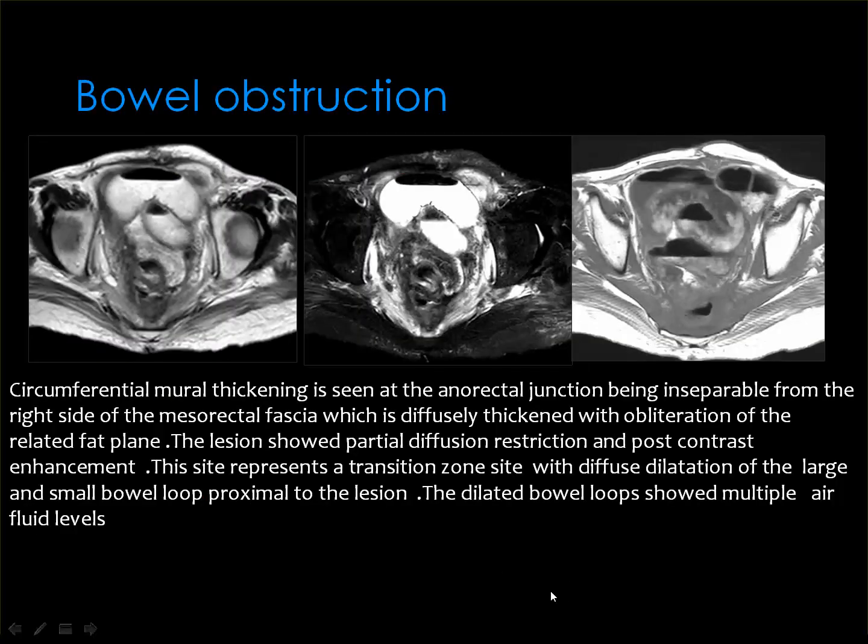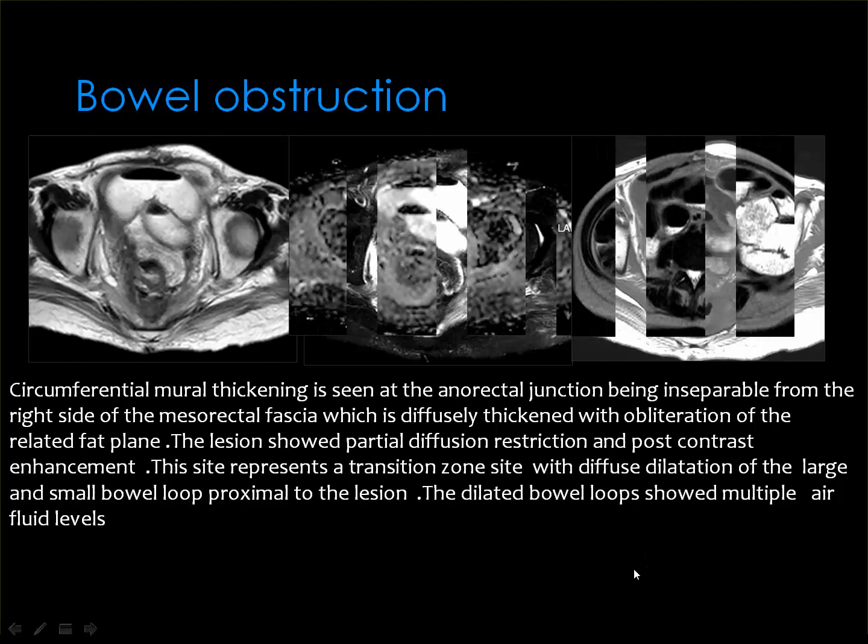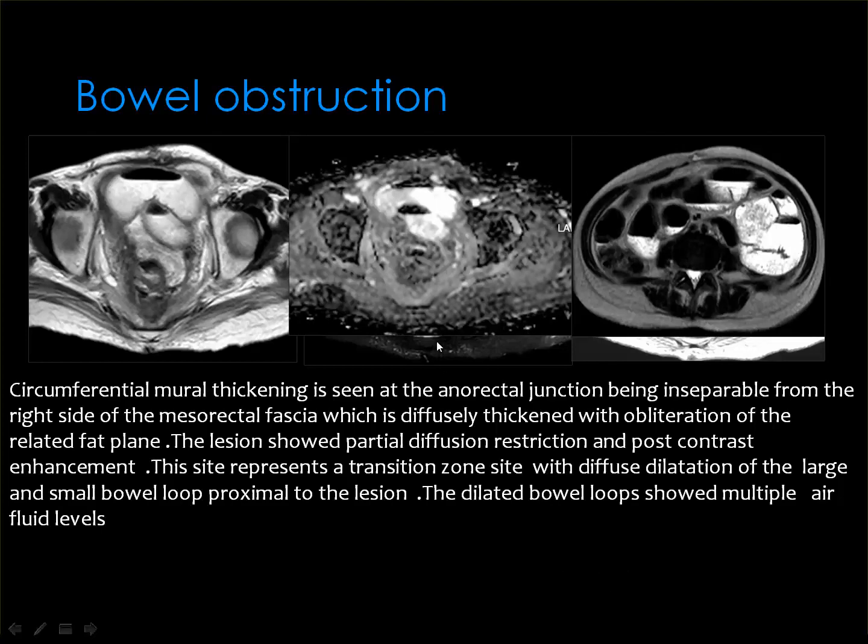And this patient has presented by abdominal pain, distension, and vomiting, all the signs of intestinal obstruction after surgery for rectal cancer. And the MRI showed that at the transition point between the dilated loops and the normal loops there is an area of irregular signal intensity, and it shows some faint contrast enhancement, and this diffusion weighted image shows some restriction.